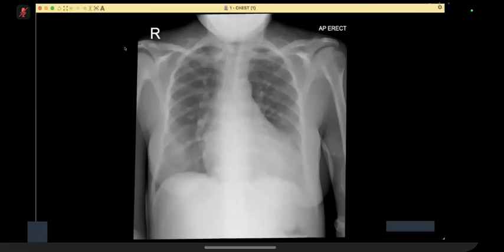I'm presented with a frontal chest radiograph of a skeletally mature female patient. I can see there is abnormal enlargement of the heart. There is cardiomegaly. Checking the lungs, there is subtle opacity seen projecting at the right lower zone. It's well defined, and there is no underlying bone destruction. I'm checking the bones, the clavicles and the shoulders.